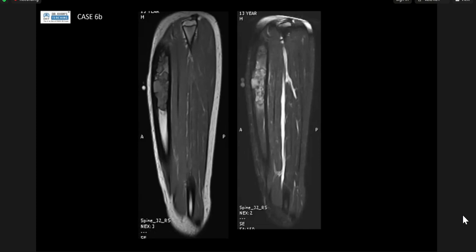Osteoblastoma would be my differential now. Sorry, what was that? Osteoblastoma, but it's not a typical location for it. Is it a diaphyseal and cortical osteoid osteoma? Okay, yeah. So there are a few things that you can get in the tibia, and they're tricky.